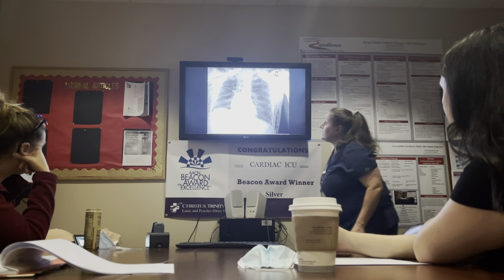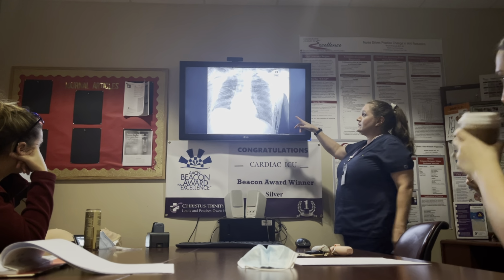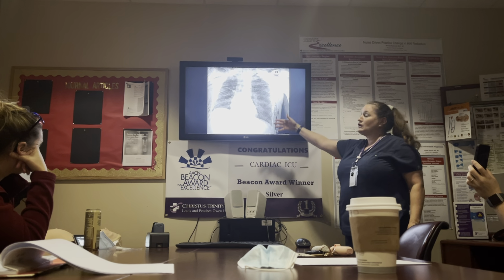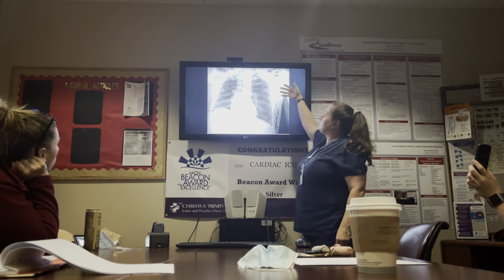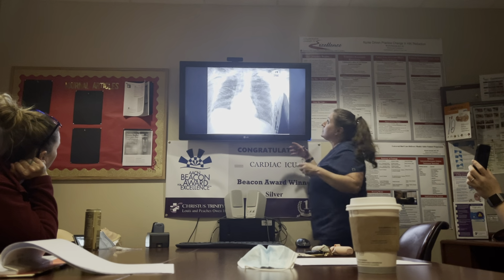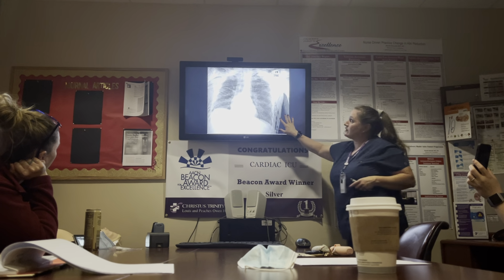Tension pneumothorax. Okay. But I want you to also be able to see, again, as I was talking about, looking at this chest x-ray, I know that there's a pneumothorax somewhere in there, but you can kind of see lung stuff all the way up, both sides, right? But you see the sub-Q emphysema, you see the pectoral muscles being aerated here because the air is going to get out whatever way its least resistance goes. You can almost see some supraclavicular air there. So you know that there's a pneumothorax both sides there.